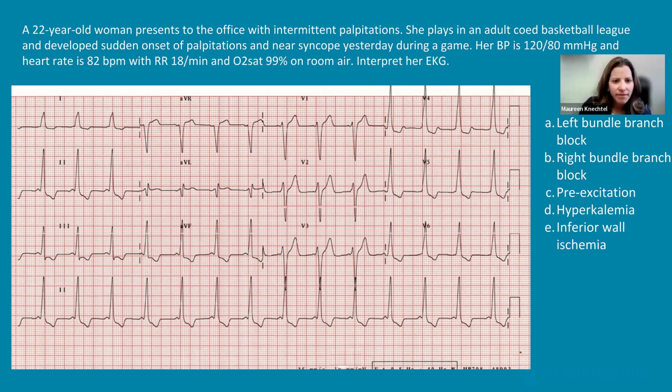22-year-old woman presents to the office with palpitations. She plays in a co-ed basketball league, has sudden onset palpitations, near syncope. There's her vital signs. What do you think is going on?